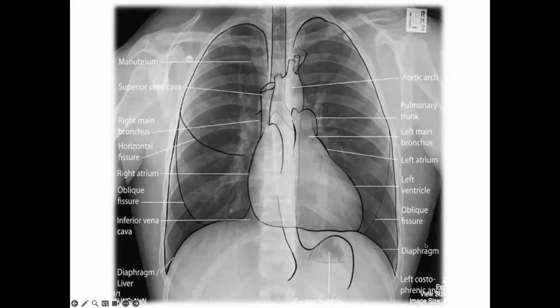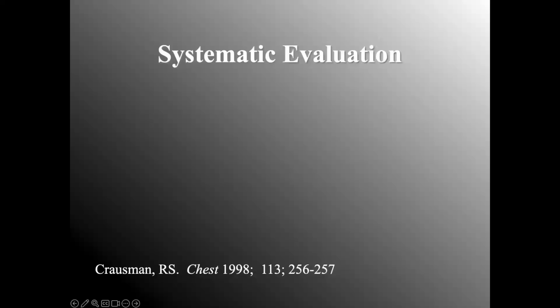You have the fissures that are labeled in the diaphragm, and then it's sort of cut off here, but that says costophrenic sulcus. Sometimes that is affectionately known on either side as just an angle. And you've got several other things as we'll get to moving forward.